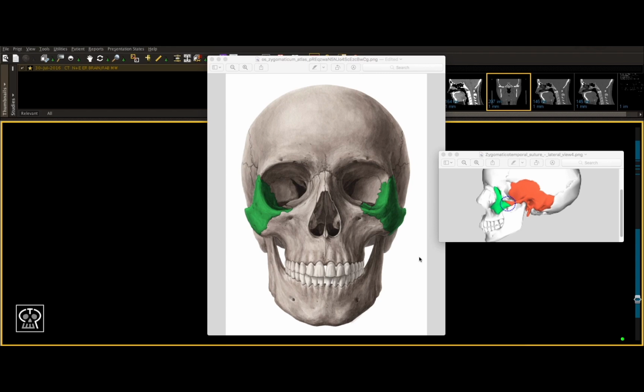Indeed, that will guide our approach to looking at the zygoma and assessing for ZMC fractures when viewing a CT scan. As you can see here, the zygoma forms a border of the lateral orbital rim, inferior orbital rim, the floor of the orbit, and the lateral wall of the orbit. So it's incredibly important to remember all the lessons you learned in the module on orbital fractures, as the zygoma is intricately related. Fractures of the zygoma can vary from a simple, non-displaced fracture at the zygomatic arch to a complex tetrapod fracture involving all four suture lines and even fracture of the zygoma itself. Because of the zygoma's prominence in the lateral face, it is vulnerable to fractures, especially when forces are transmitted to the bone and thus to its suture lines.